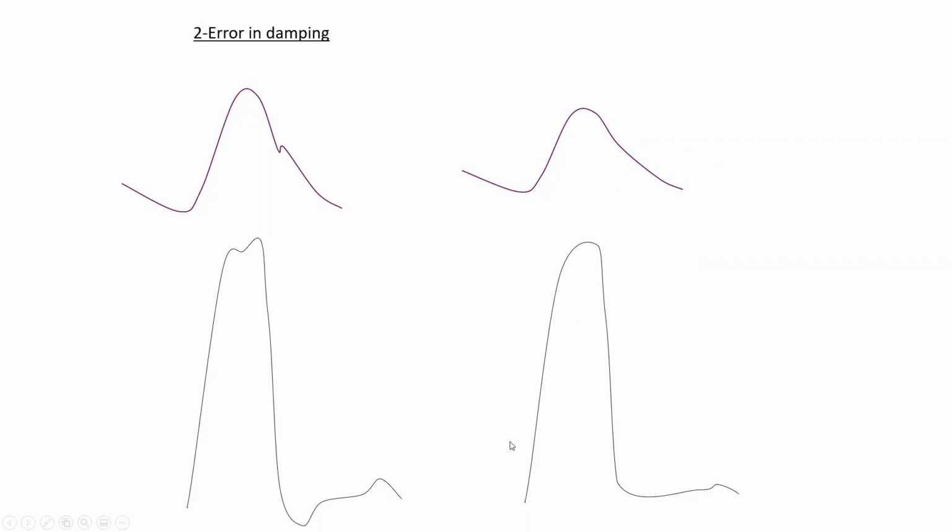That's a damped recording. That's a damped LV, very smooth. No LV dip here, no dips here. So it's an extra smooth recording, okay? Conversely, there is another error, maybe not relevant for this talk, called underdamping, where you have too many notches on that tracing. Unlike too smooth, too many notches. You want it to be perfectly damped, which is this.